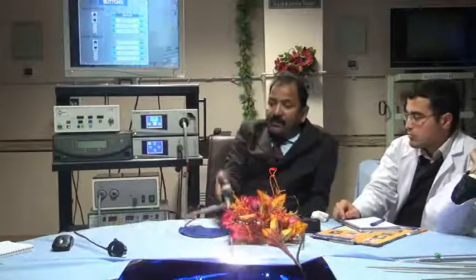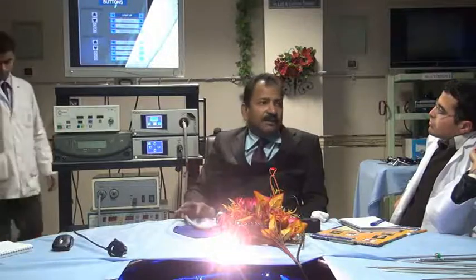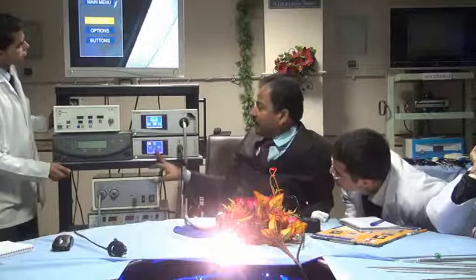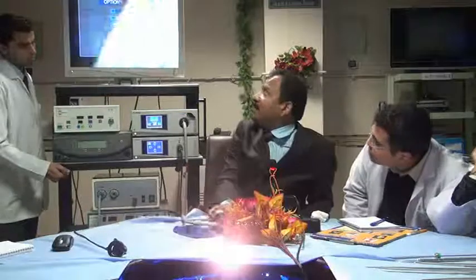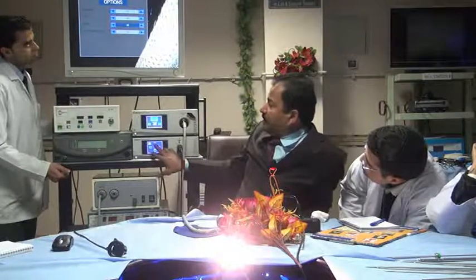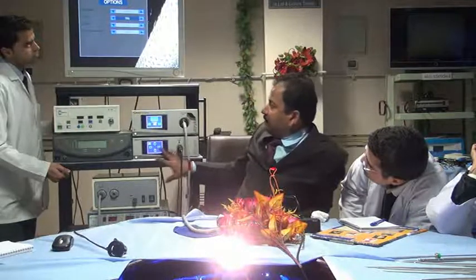This is up one. This is this one. What is it? Yes. So this is called digital enhancement and this programming. According to that programming, you can adjust. Generally, here we have programs, and I will show you those programs. Then you have the other options. In these options you have the standard, then the far, then the output. Here it is 720. Someone has kept that, that's why the quality was not very good. I will make it now 1080.